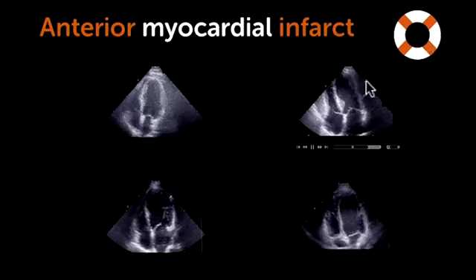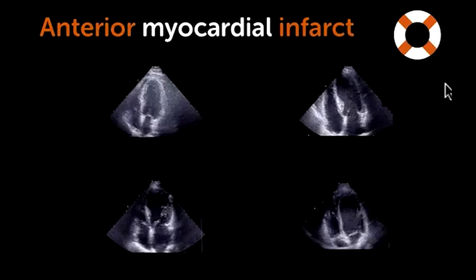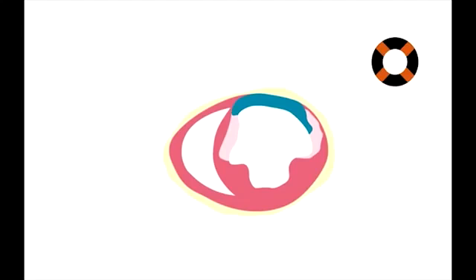In contrast, the other 3 patients had a rather large myocardial infarction with significantly reduced left ventricular function. You now know how to quantify left ventricular function. Coronary hypoperfusion, ischemia, and acute infarcts can cause wall motion abnormalities and eventually scarring.